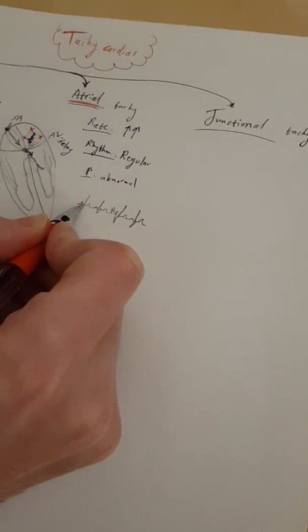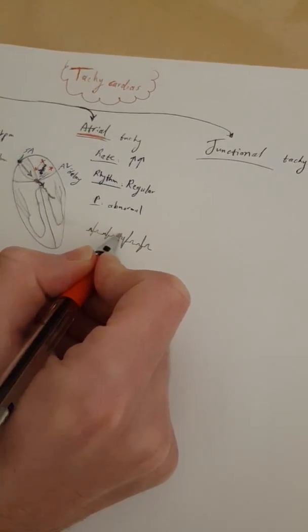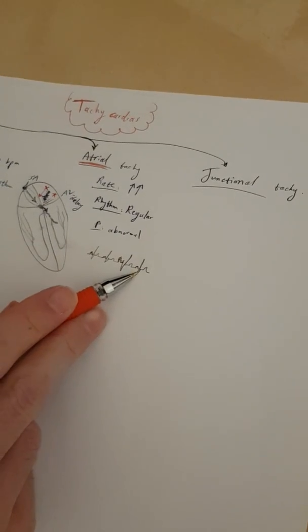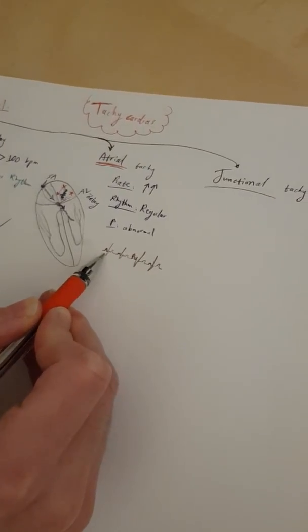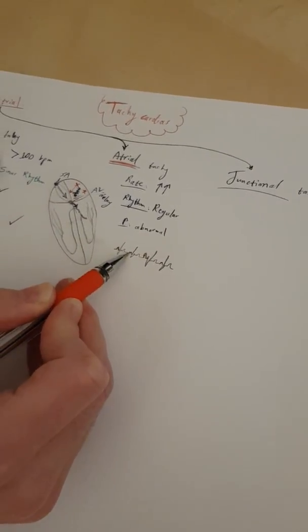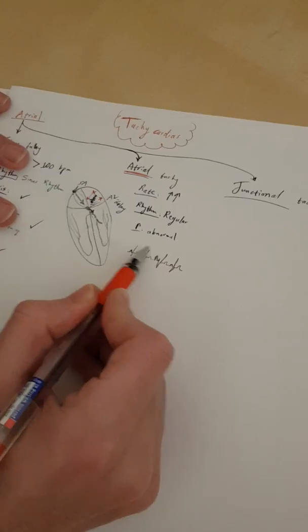So you see that the P waves that we have, this one is kind of peaked or something. This one looks like an M. This one looks crazy. And this one is like normal. So you see QRSs, sorry, this one should be narrow. My drawing is not really the best. So you see that normal QRSs all of them should be narrow, meaning it's conducted normally, but they're originating from different P's, from different P waves. And this means it's atrial. This is multifocal atrial tachycardia. Of course, it should be tachy. Yeah, there's a lot. And that's it.